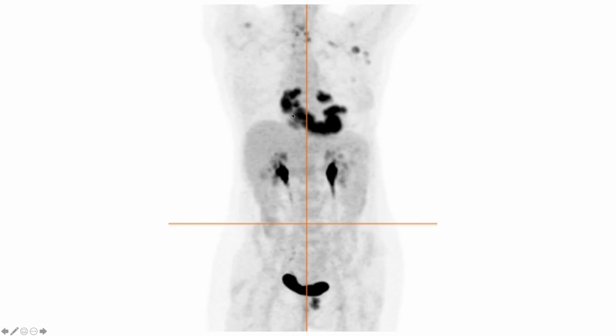To me, this looks like mid-myocardial and epicardial, or what do you call this, transmural? You're correct. It's more mid-myocardial and sub-epicardial. So then I guess myocarditis I would also add, but I wouldn't really expect it to be thickened, so I'm not entirely sure what this is. Well, I think sarcoid's very good.